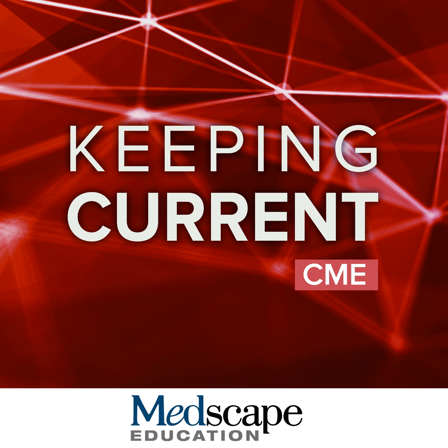The absence of enhancement is also important. This is an example of a patient with acute chest pain and stunned myocardium. This is known as Takotsubo cardiomyopathy or stress-induced cardiomyopathy, where you essentially get stunning of the myocardium. You can see the wall motion abnormality at the left ventricular apex, but no evidence of enhancement. So this is a good prognosis for this patient.